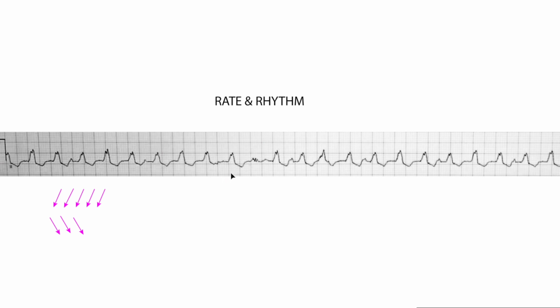I'm looking at this ECG, and the first thing that stands out to me here is the width of the QRS, right? So this QRS is kind of wide. So my mind immediately goes to bundle branch blocks. So there's some sort of a conduction delay going on here, and that's kind of supported by this inverted T wave. That could be a secondary repolarization characteristic found with bundle branch blocks.